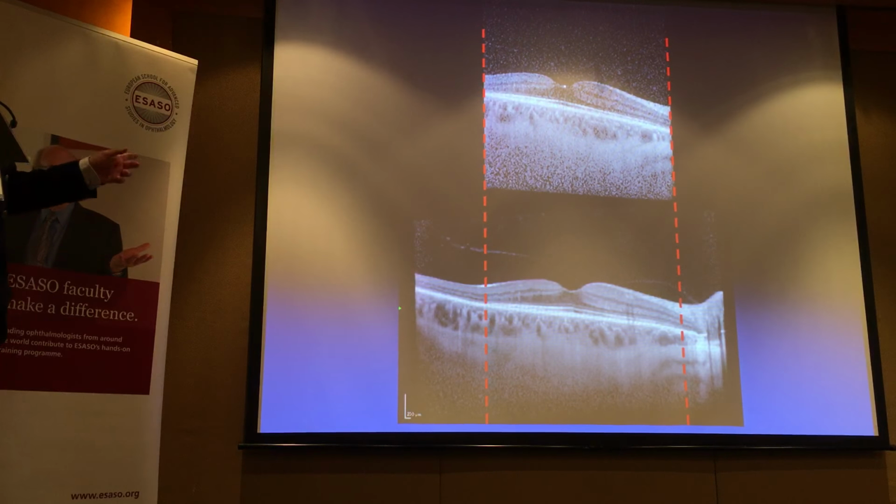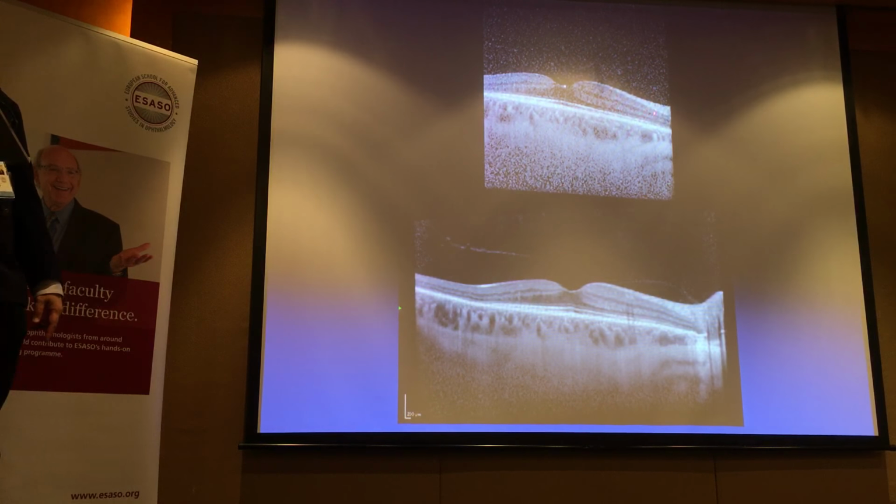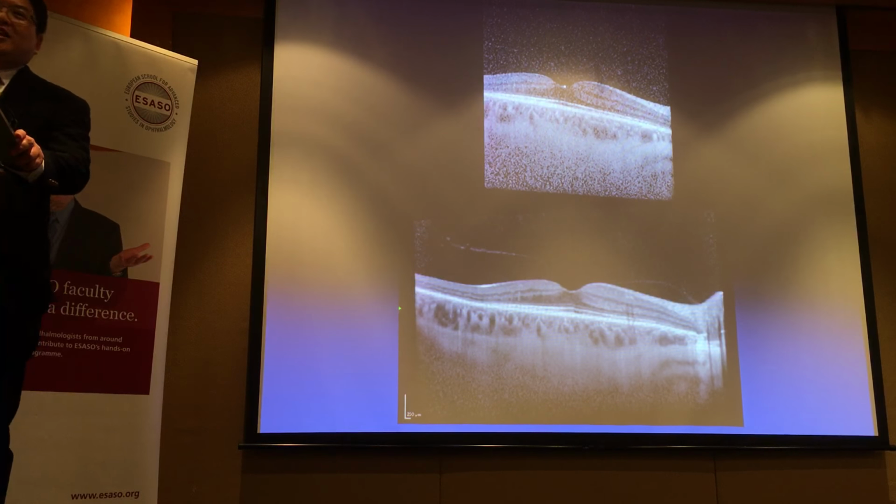Actually, it was a Plaquenil toxicity in this case, but yeah, it could be, right? The point is that there was abnormality. But if we rely on this, you will continue to say, oh, normal, until it expands further in, right? So that's the illustration.